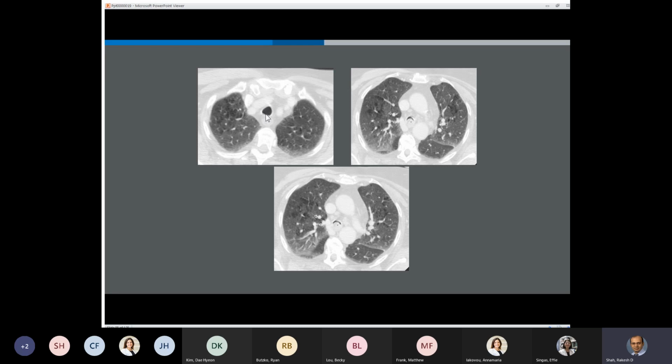When we take in a deep breath, as I mentioned, the posterior membrane bulges out. When you expire the air, the membrane will bulge a little bit in, but it should never become like this. So the cartilage allows the trachea to maintain its shape, particularly in expiration.